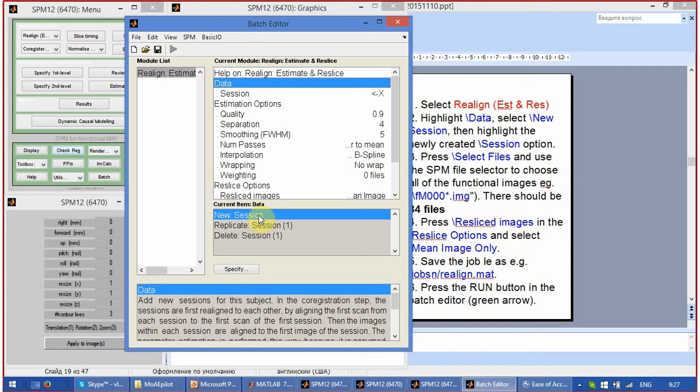CSF is brightly colored in the functional scan, and the gray matter is much more dark. So if something that in this particular voxel has been dark turns bright, the software perceives it as an activation, which is obviously an artifact and is very harmful for estimation of the real activation.